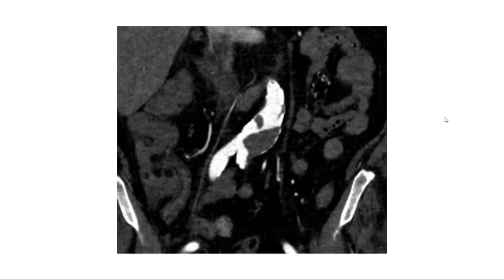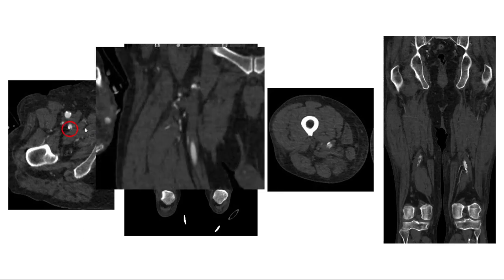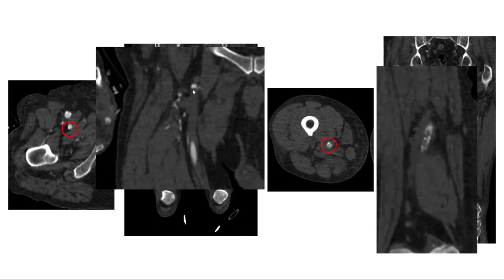Well, this is an interesting case from a couple weeks ago. In this patient with a AAA and this windsock type of plaque within the aorta, just waiting to fire off, probably down the right leg, because we've got our nice little Lion King cliff here to avoid the left common iliac artery. And lo and behold, this patient had an embolus to their right profunda. Here we have a nice convex meniscus sign, and then unfortunately also to their superficial femoral artery, a nice beautiful convex meniscus sign. So unfortunately he threw an occlusive embolus to his profunda and to his SFA.